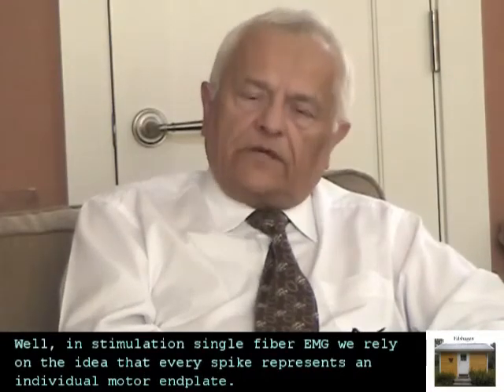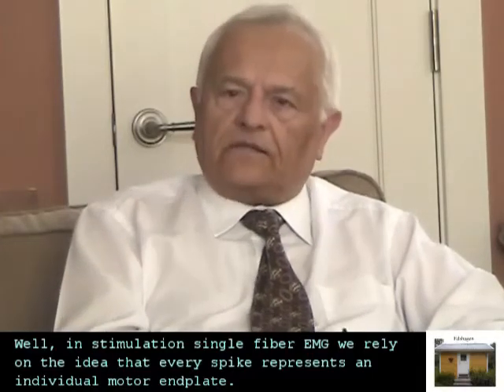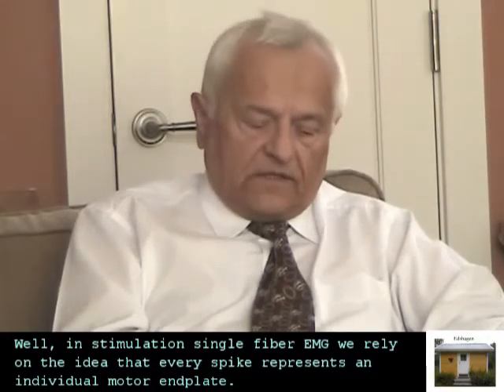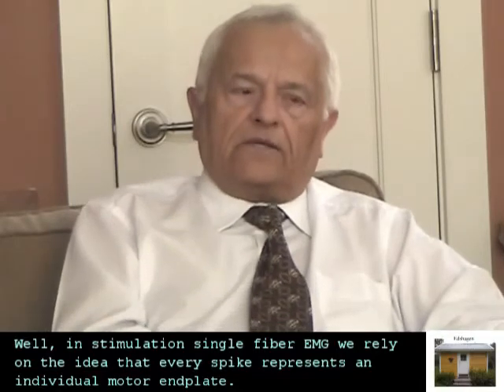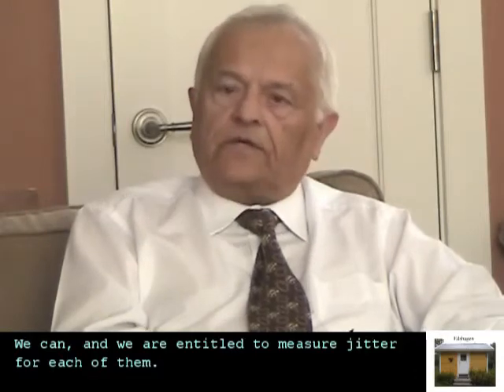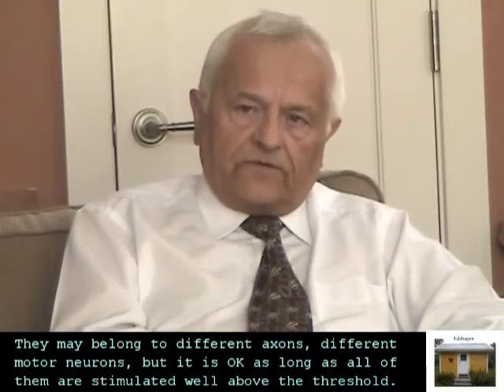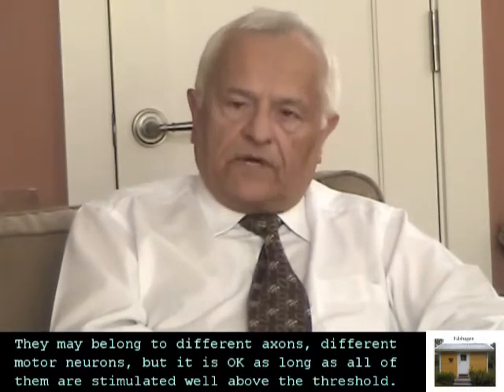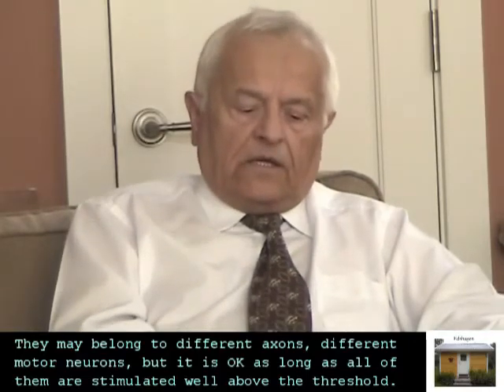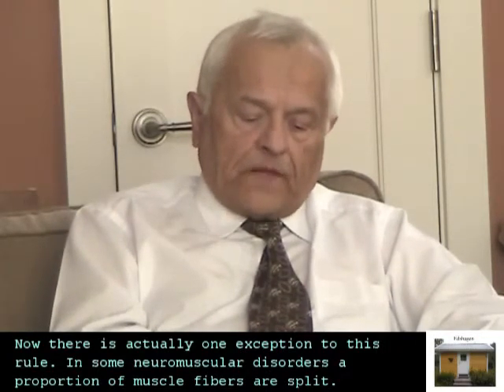Well, in stimulation single fiber EMG, we rely on the idea that every spike represents an individual motor end plate, and we are entitled to measure jitter for each of them. They may belong to different axons, different motor neurons, but it is okay as long as all of them are stimulated well above the threshold. Now, there is actually one exception to this rule.